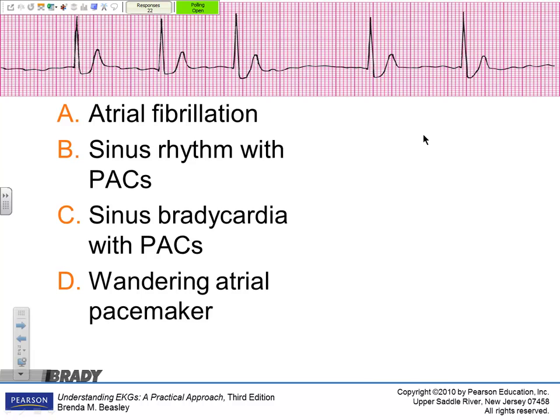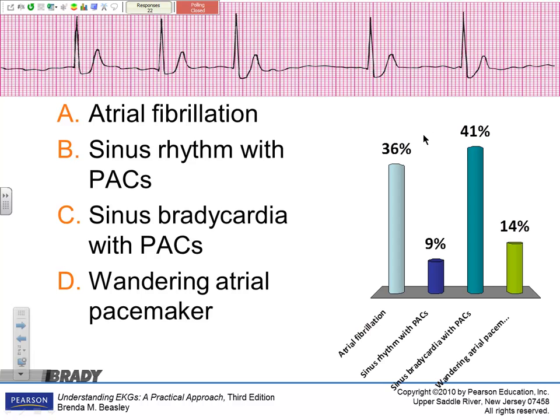Oh, one last one. Okay. Who's right? Can you see a clearly defined P wave on there? Is it irregular? Yeah. Even though this doesn't look messy like a lot of your AFibs, you still can't really identify a P wave that's consistent through there, and it's definitely irregular.